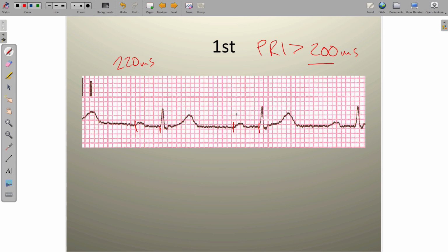Now, please understand that we've gotten lazy in medicine, and we kind of name things by the degree of heart block, but that's not really accurate. The better way to do this would be to say that the level of heart block is something that happens within an underlying rhythm. So in this case, there are P waves, they're upright and rounded, they precede the QRS complex, which is of normal duration, and the rate here is 300, 150, 100, 75. So in fact, this underlying rhythm is sinus rhythm, and then we'll add this modifier with first degree heart block.